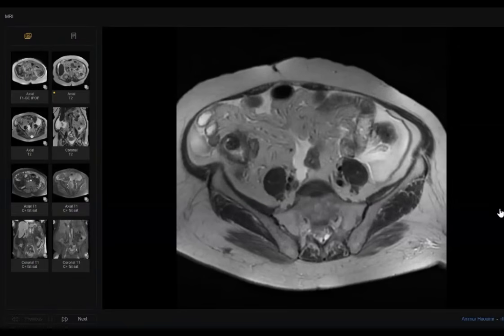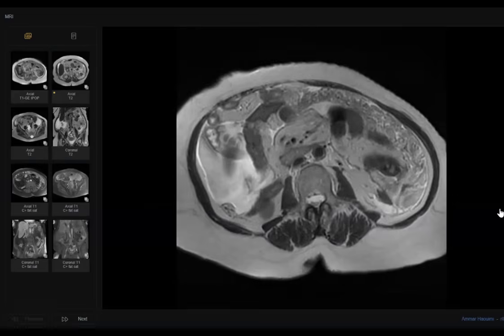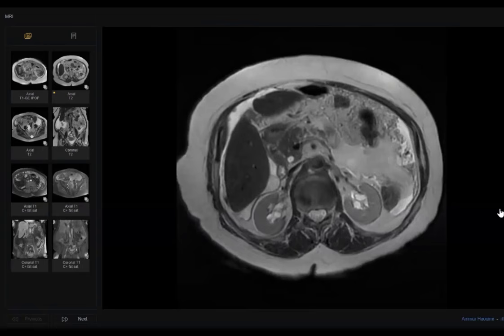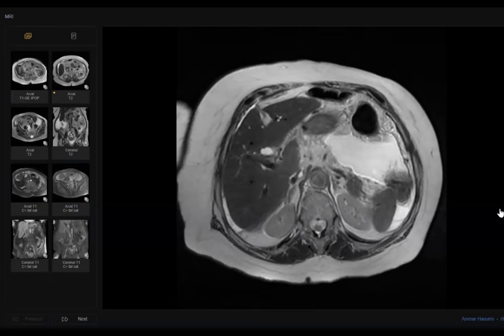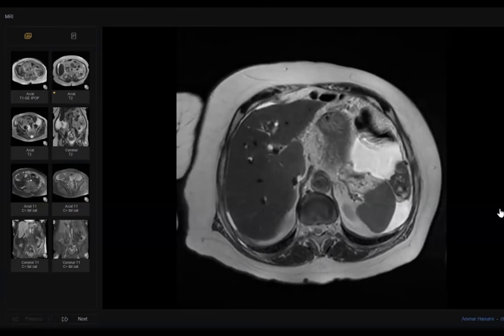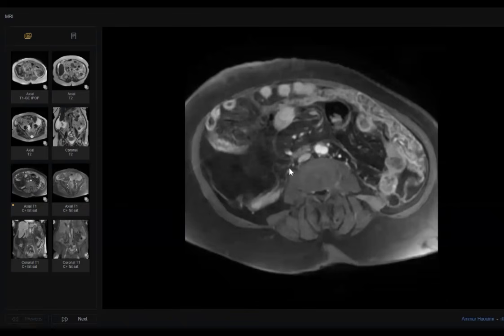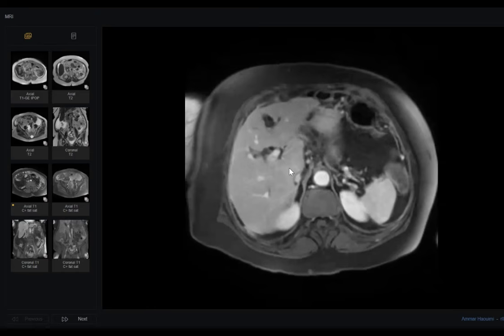So these are just a set of the images now. Right now, the things which I can appreciate are moderate abdominopelvic ascites and omental caking. The most likely cause I must be thinking of would be stomach thickening. I would like to have a look at the stomach, and the stomach is underdistended, and I don't appreciate any gross thickening.